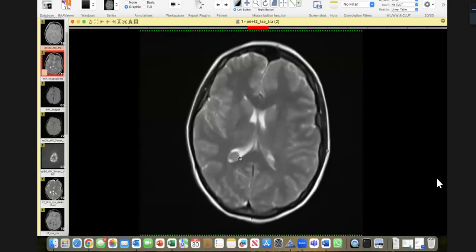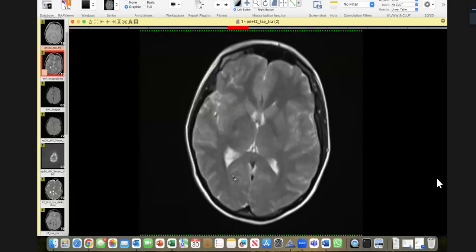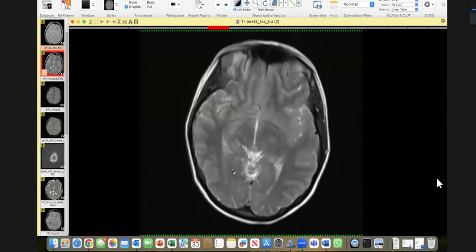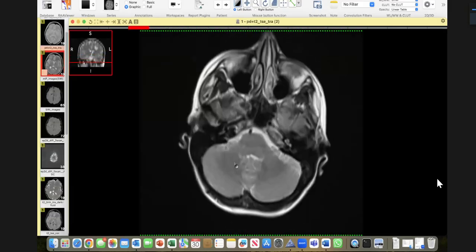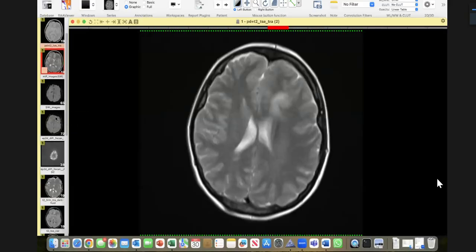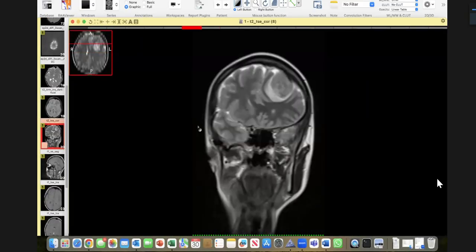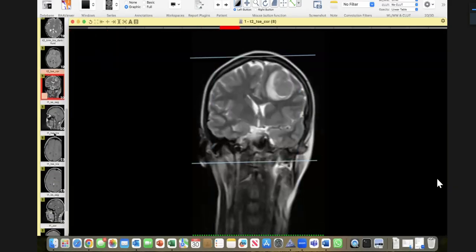This was a question. And by the way, this is not the occipital horn. The occipital horn is down here, and you cannot see it. This is the trigone, the atrium of the ventricle. So this is not the occipital horn. Now, what do you do in your clinical practice? Go for contrast. So to ask here for a T2 coronal was not needed. Because you asked for it, I just gave it to you, but you wasted your time.